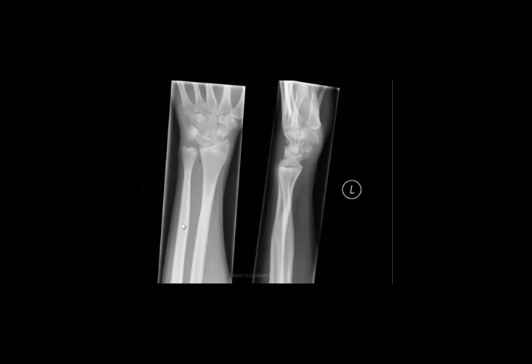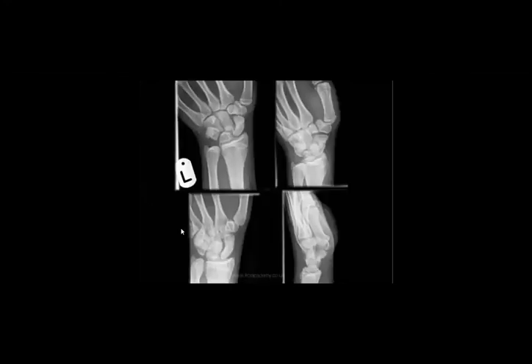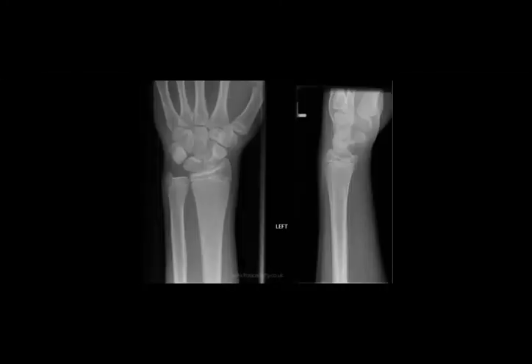Nice. Again, the most common one will be scaphoid, especially when you have a scaphoid view. So it is an easy one. Again, another example of scaphoid fracture.